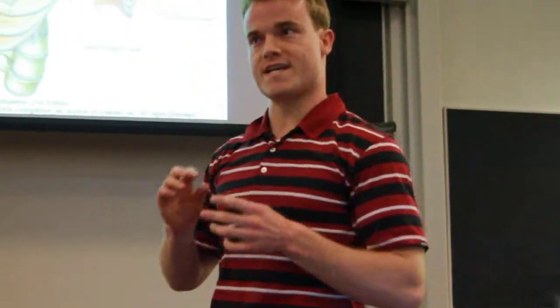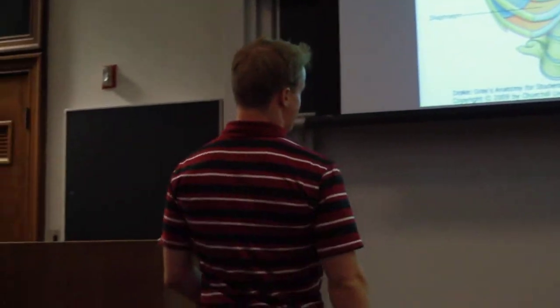Right here you can see the rib cage, and you can see the different areas are more white or more black depending on the particular type of density that is in that area. So the physics behind an x-ray is the darker it is, the more air there is, the whiter it is, the more dense or the more bone you're going to see. So this is the anatomy. So this is what the doctor wants to see when they take that picture of your chest.